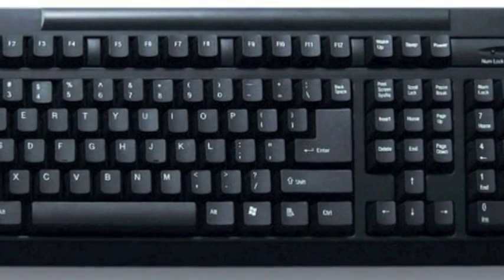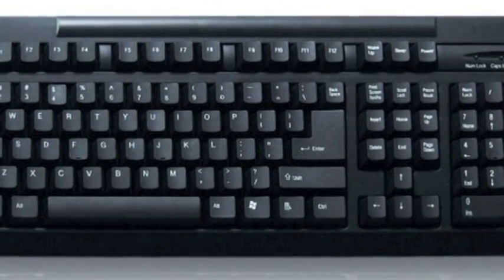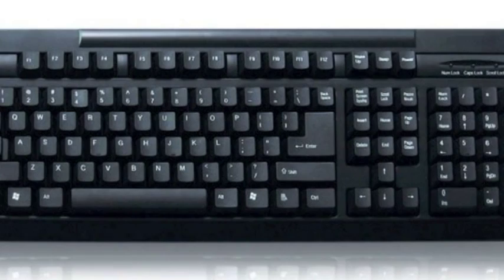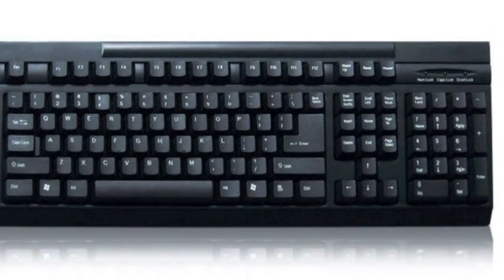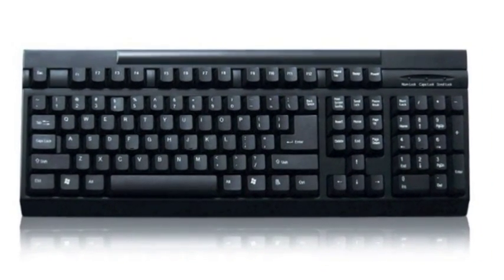We will first discuss the standard keyboard, which is designed for the general population. The standard keyboard is the most commonly used keyboard, measuring approximately 6 by 18 inches. The keyboard requires excellent finger range of motion for all 10 digits and also muscle strength in order to reach and press the intended keys.